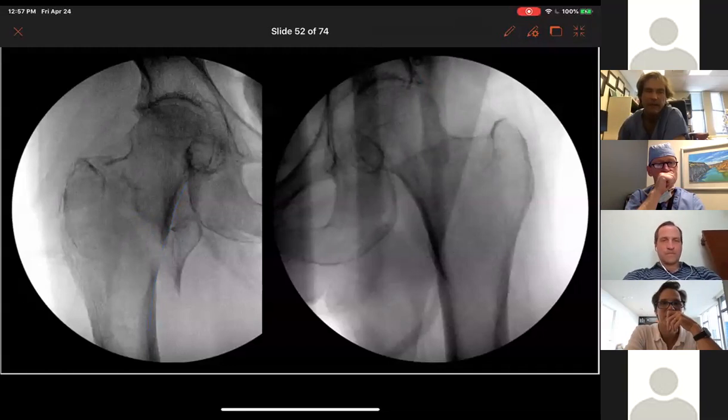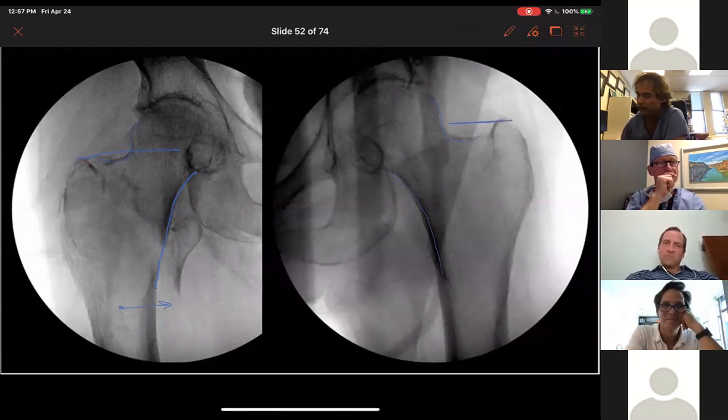So I felt like I had lateral translation of the shaft. I felt like it needed to move that way in order to restore that medial femoral neck shaft confluence that we're seeing on the other side. I felt like the shape of the head and neck looked reasonable here compared to the contralateral side. I felt like the location of the tip of the troch was, if anything, a little bit valgus compared to the contralateral side.